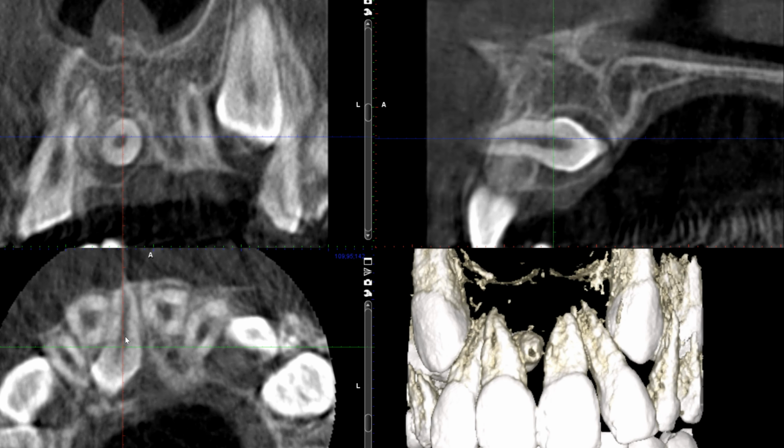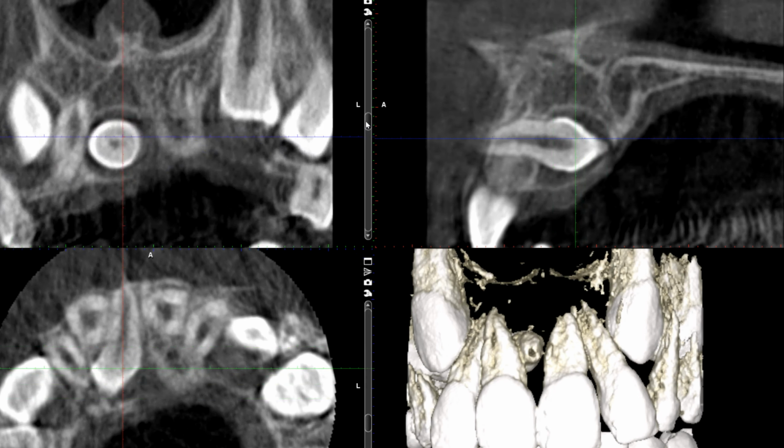I would have to look up the chart to see exactly, but I think the effective dose from this limited field of view is very comparable to a few periapical radiographs. So it's not a lot more radiation dose than you might expect. Being able to get this information at the cost of maybe 2 to 3 periapical radiographs, that's terrific, right? It's really good information.